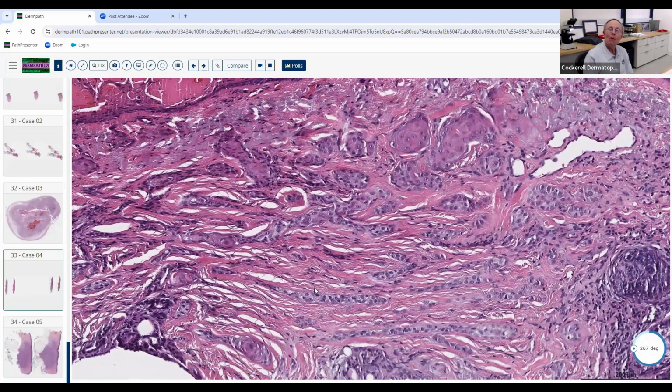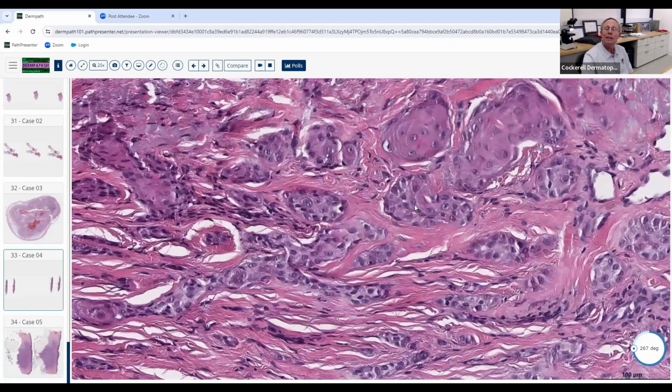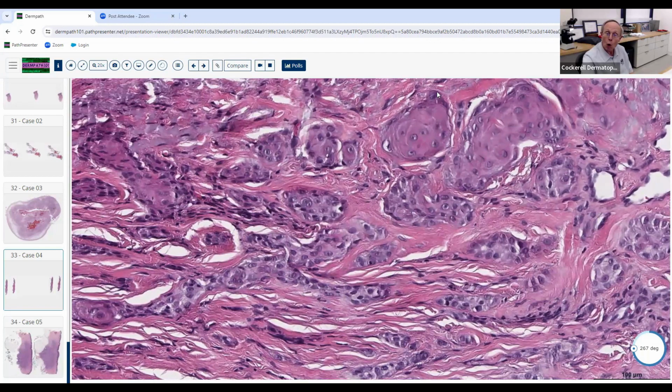Ring any bells? No, but I was thinking this could be an eccrine. Okay, well, eccrine is one of the three types. There's a thing called the syringomatous carcinoma, also known as microcystic adnexal carcinoma, which is what this is. And one of the ways that you can tell those apart from the other two are these whorls of squamous epithelial structures in here. Is that like the squamous eddies? These aren't really squamous eddies.